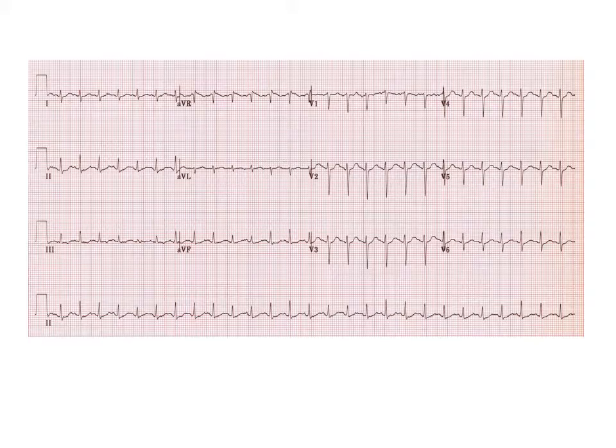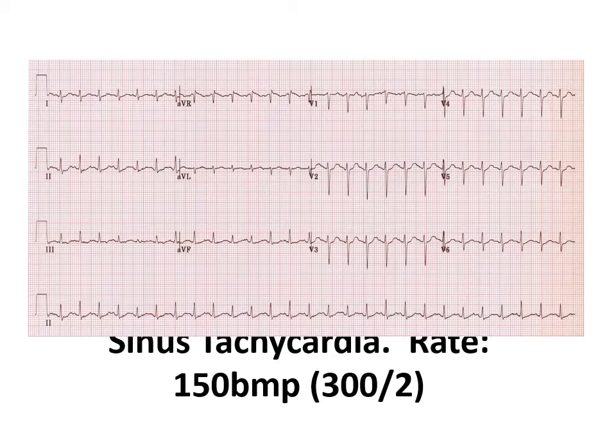Really regular. Maybe, maybe not P waves. What do you think? Could be SVT. It's hard to tell sometimes, is it sinus tach or SVT? On this, we're calling it sinus tach, a rate of 150. I would argue, though, that this is probably more SVT.